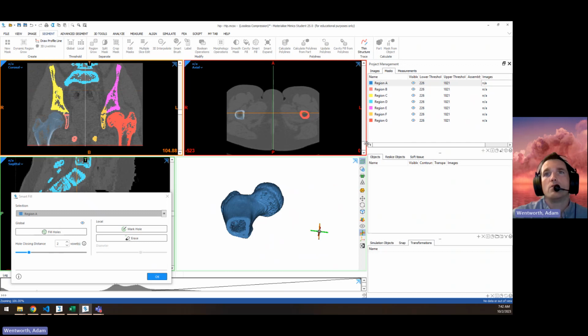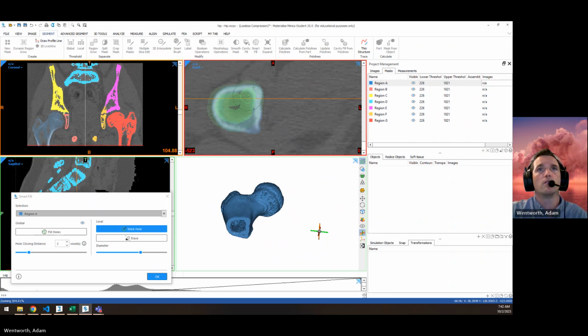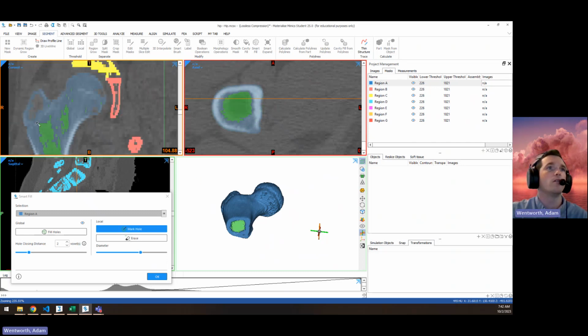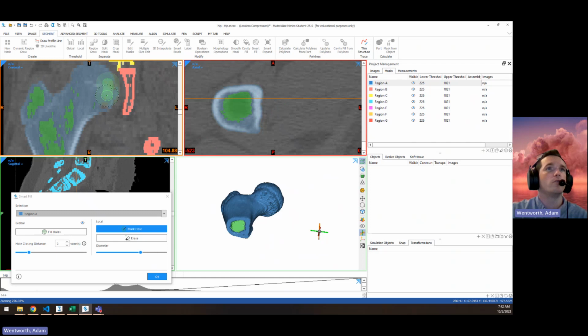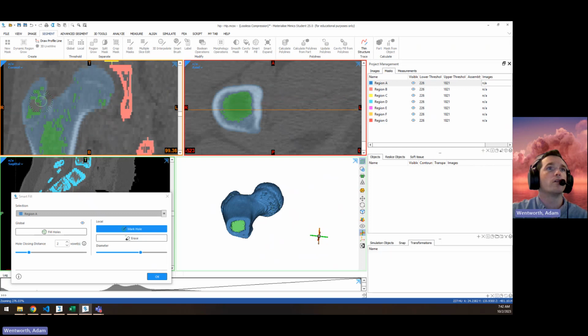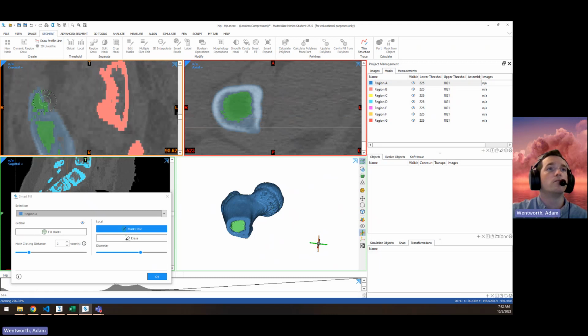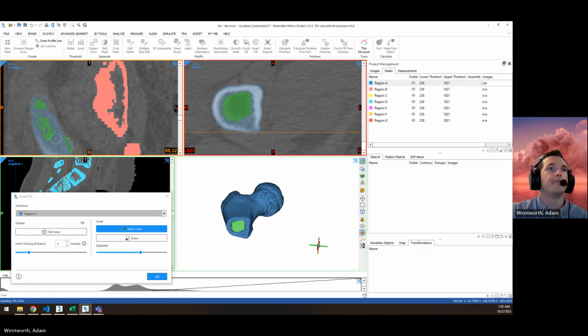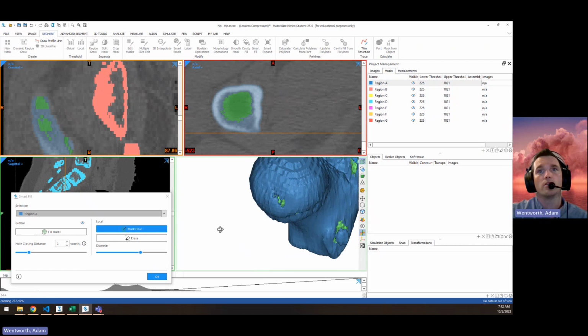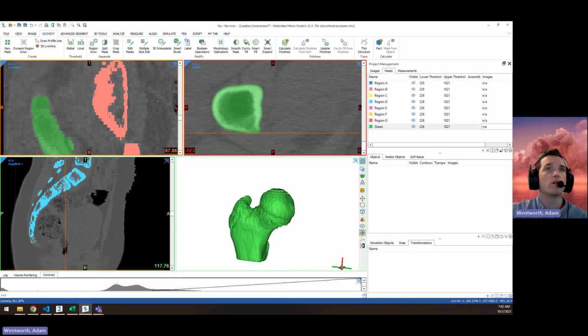So we'll go to the bottom of our axial views and do mark hole, and Control right click and dragging up is zooming in here. Just mark that. Then we can go on our other images and mark where those edges are. Scroll through our images, check that we're getting all the holes filled in. You can also check on our 3D and make sure that the holes are getting filled. You can also use some wrap functions after this. I'm not super concerned about that.